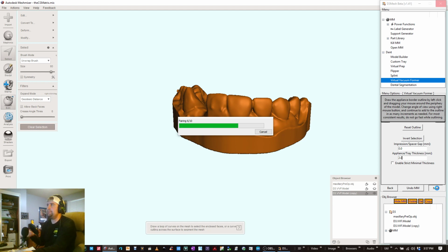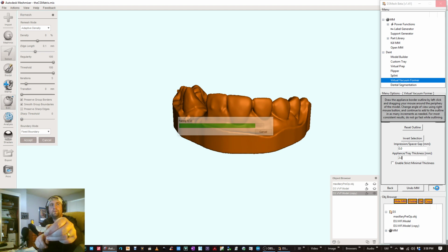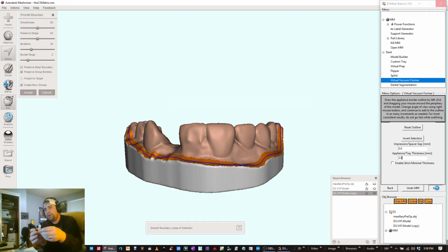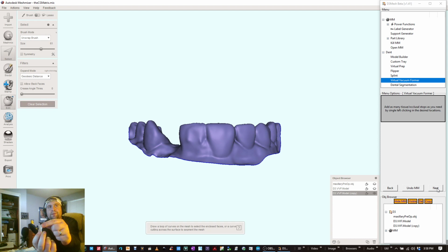And this is not what I have right here. This is the indirect bonding tray resin, and it was a prior attempt at doing this on my own, just kind of testing around. I don't know if you can see that or not, but it's very flexible. I think I might have just ripped it there. It's like bleach tray material. That's what it feels like.